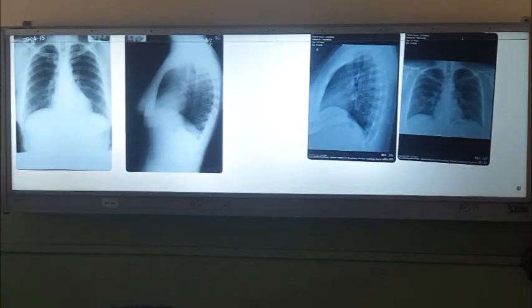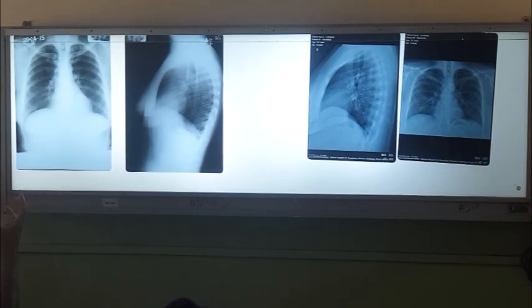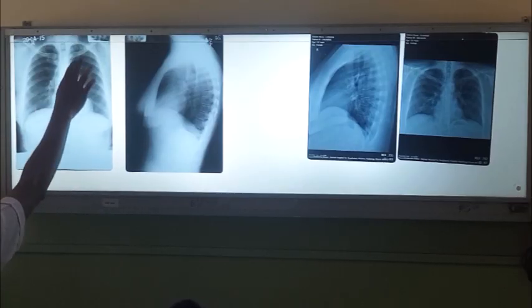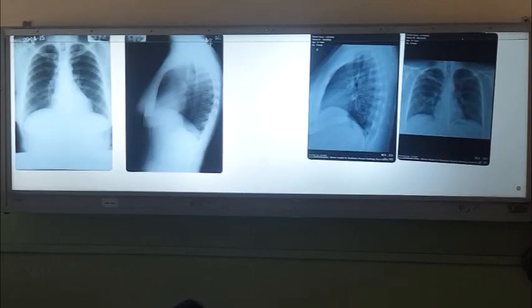Sometimes in bronchiectasis and bronchopneumonia or some other conditions which involve bronchial thickening, you will see the bronchial markings also in bronchiectatic patients. Otherwise, this is what you see here. These are vascular markings. Then look at the size of these vessels compared with the cardiac shadow. If these are dilated, think of pulmonary hypertension. Okay, and then the distribution of the vessels. Normally the lower lobe vessels are bigger than the upper lobe vessels. If you see bigger upper lobe vessels, you think of upward diversion. That happens in cardiac failure. Right? Okay.